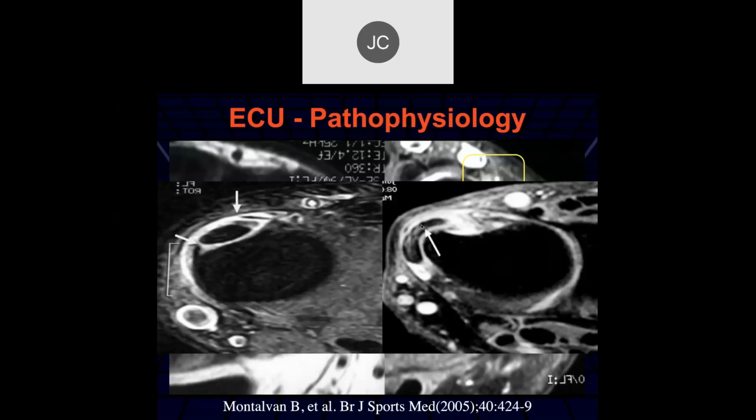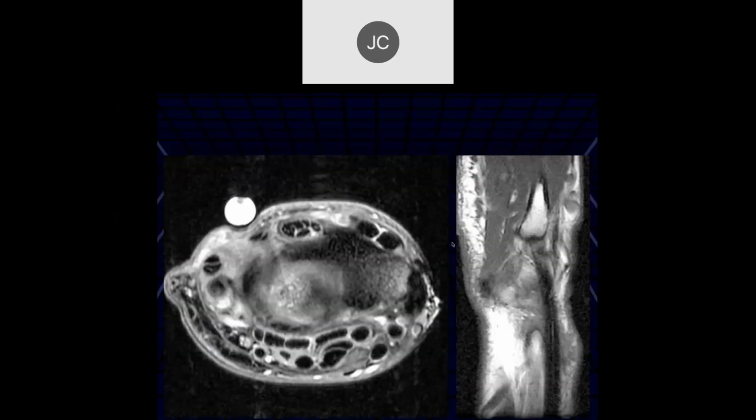And in this case, since the subsheath is torn and the retinaculum is torn, we're getting a displacement, an instability of the extensor carpi ulnaris tendon. So if you're really concerned about instability, some people will do pronation and supination images, especially imaging the patient in the position where they feel the popping and the symptoms.